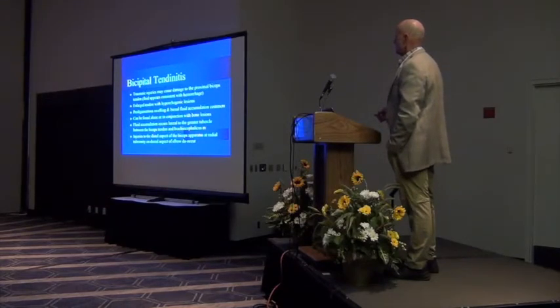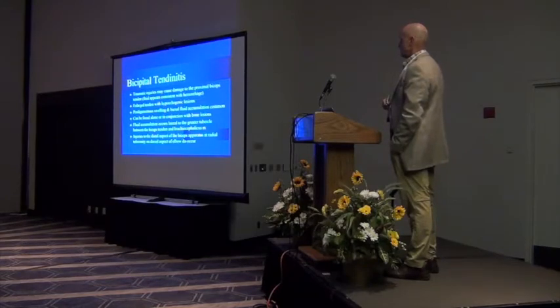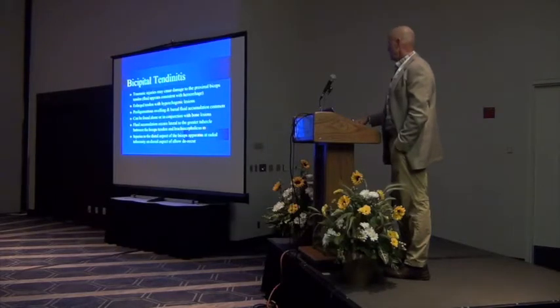And I'll show you on an MRI that there are bone edema responses associated with that as well that can probably be related to some of the chronic pain that we see with them. And as well, when you bone scan some of these horses, you'll see some reaction in that area. So there's certainly fluid accumulation, and it may be that some of the bone response is in relation to the pressure from the fluid that's generated.